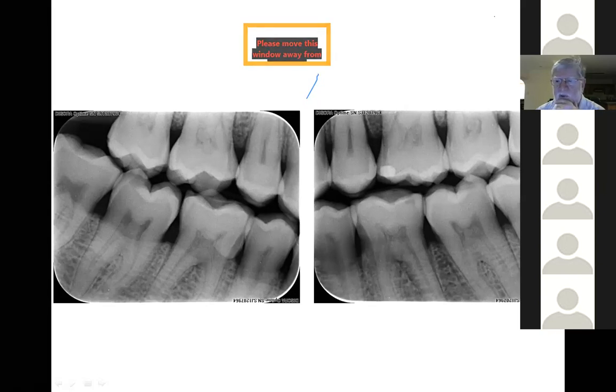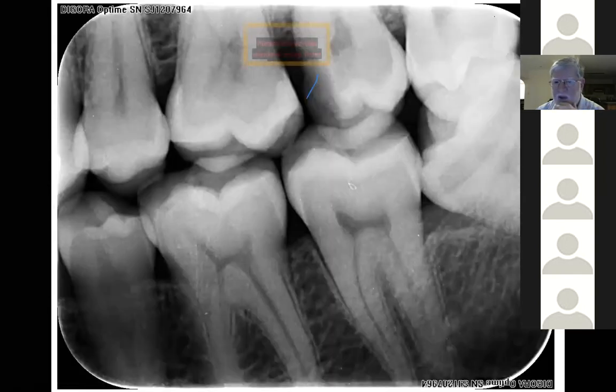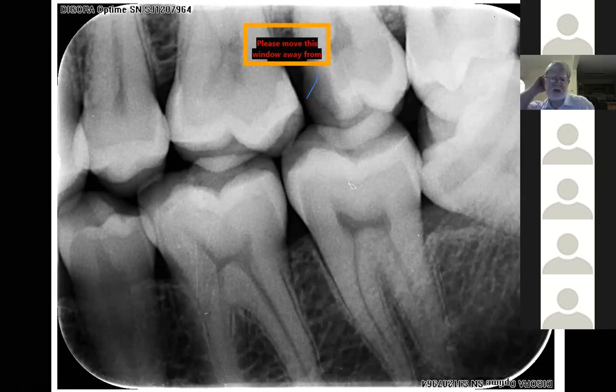But let's suppose a couple of teeth were broken, then I will often have the bite wing up on the screen behind the patient, and I'll look at that, and I've studied it, and I know where I want everything to be. So this patient, this was very, very recent. Patient came in and he said that this filling had fallen out. He had just bought an air flosser, and using the air flosser, the filling fell out.